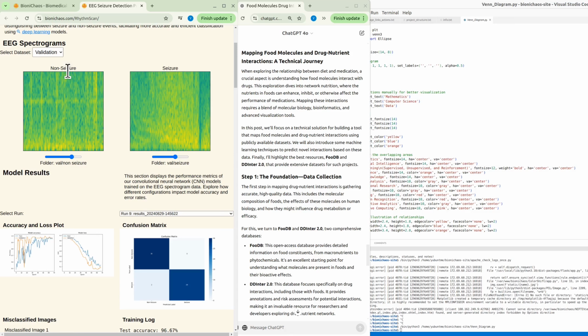So it's 600 images, non-seizure and seizure spectrograms of time series EEG. Here you can just see noise and baseline. In the images on the right, you see noise and seizures. So those are spiking, neural spiking activity, slowing down.